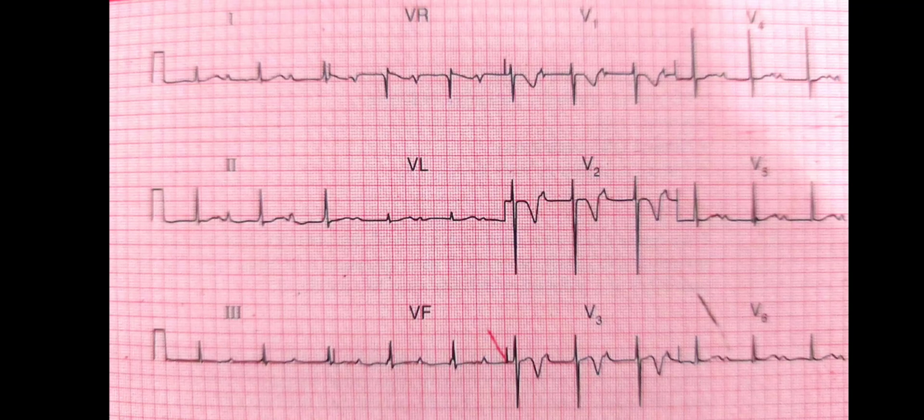So in this very first ECG, as I have told you, we first of all look for the rhythm. Here we can find the P waves in lead 2, so this is a sinus rhythm. Then calculating the rate, we divide 300 by the number of big boxes present between two RR waves, which is approximately 60 to 70 beats per minute. As I have already told you, it is better to tell a range than to quote a single figure.